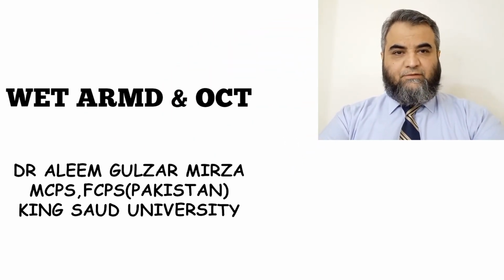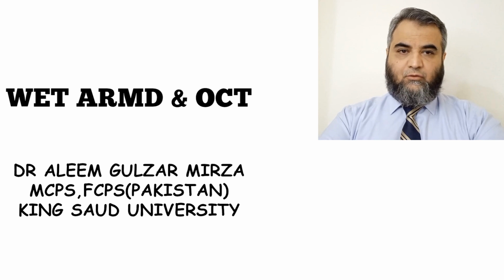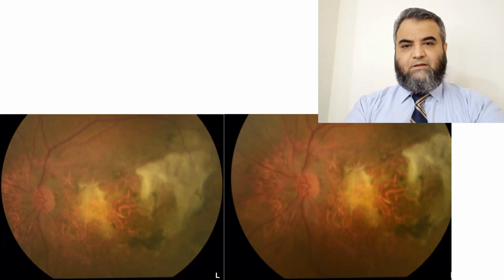Today my topic of discussion is wet age-related macular degeneration, especially the use of OCT in the diagnosis and the management. The patient who presented to my clinic had been suffering from wet ARMD. It was already a cicatrized choroidal neovascular membrane in both eyes.